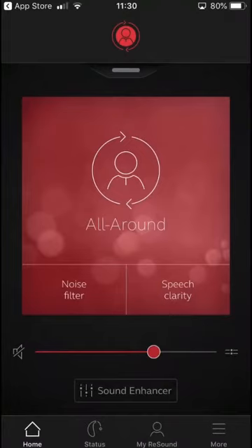The hearing aids in this example are set up reasonably simple. At the top, along this top bar where my arrow is moving, you'll have up to 4 programs. In this example, we have one. It's our all-round setting, which is our automatic or normal setting. The hearing aids, when you're using them, you can decide to adjust them to suit yourself and to meet your preferences.